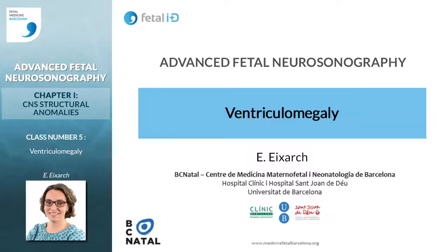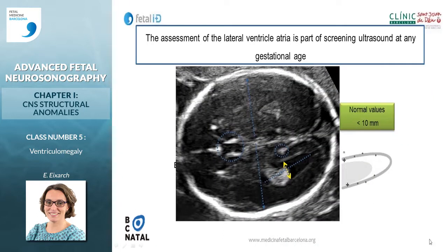We are going to talk about the diagnosis, the differential diagnosis, and the management of ventriculomegaly. And we will start by defining what ventriculomegaly is. We have to remember that the lateral ventricle atrium must be evaluated in the screening scan at any gestational age.